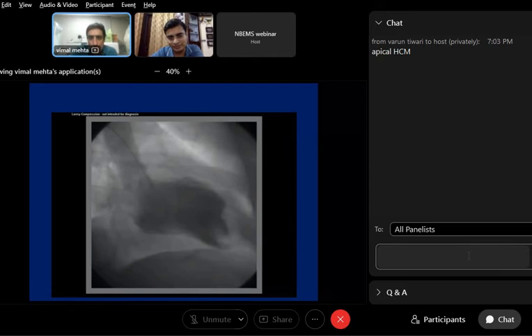It's an old thrombus. Okay. Why do you call it an organized thrombus? Thrombus is adhered to the wall. Okay. But how does it, okay. Layered thrombus, maybe ischemic or non-ischemic, white shadow.